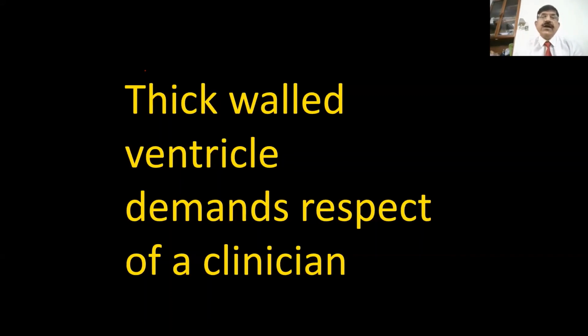Similarly, chords are actually again measured in systole. If they exceed 20 millimeter, they are elongated. Okay. Chords more than 20, AML more than 20, PML more than 14 millimeter. If they are more than 14 millimeter, it is elongated. Having said that, an absolute value for AML elongation without any doubt will be 25 millimeter or more.